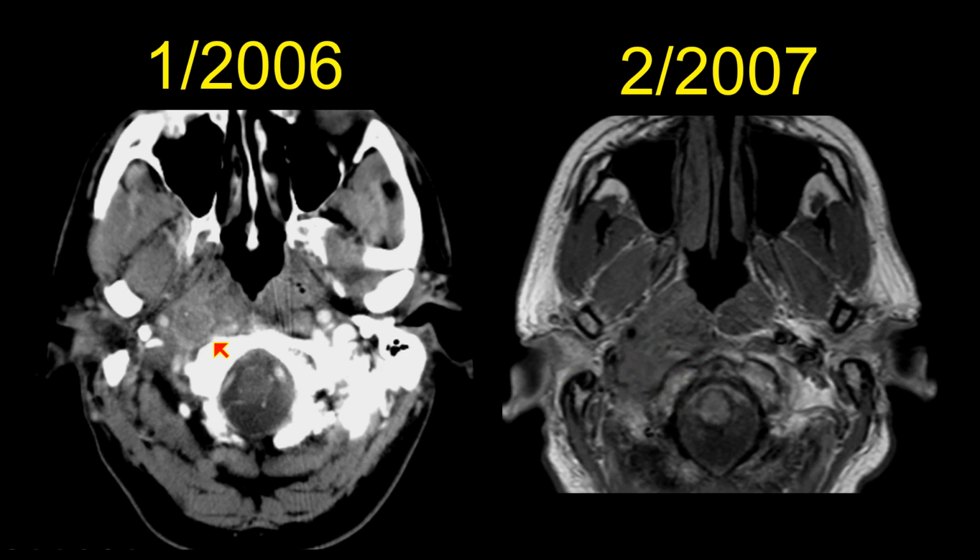And I suspect in this case that each time the radiologist at the outside shop was misled by the prior report, which said normal over and over again, even though the patient had a positive pathologic retropharyngeal node over and over again. So that's an example of how it's important to look at the prior reports, but don't necessarily blindly believe everything they say.